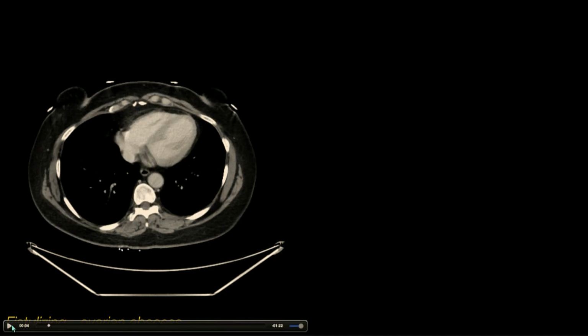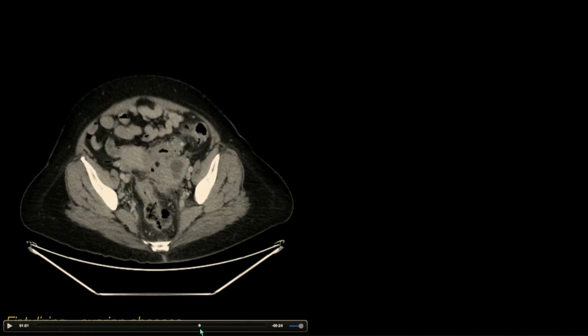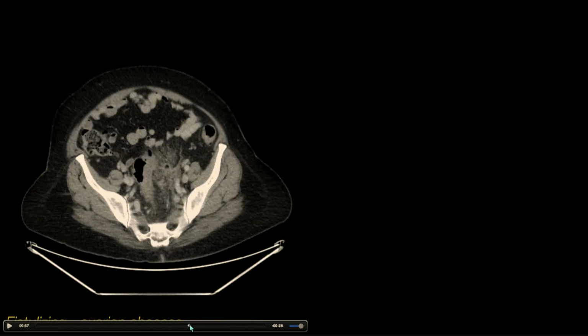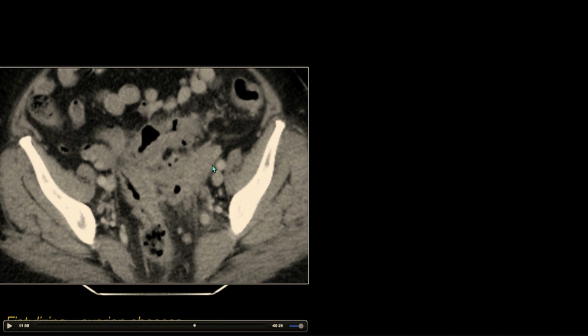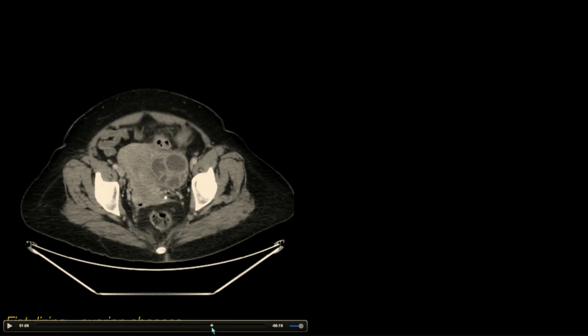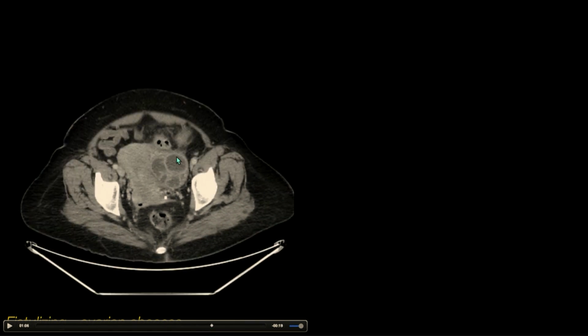The different flavors of fistulizing diverticulitis can include a fistula of the ovary here. So here we have, along the sigmoid colon, this kind of fistulous mass, this kind of complex arborizing web of inflammatory tracts, and eventually tracking into the left adnexa, causing this typical multiloculated abscess.